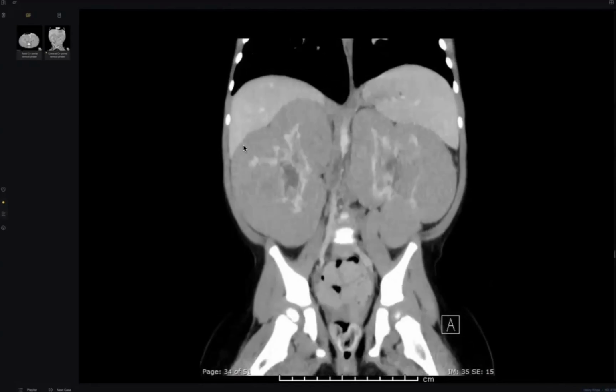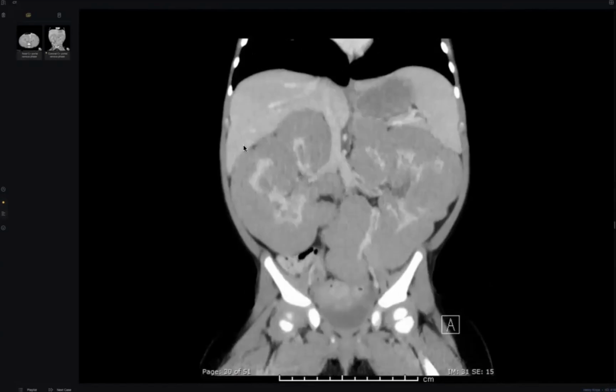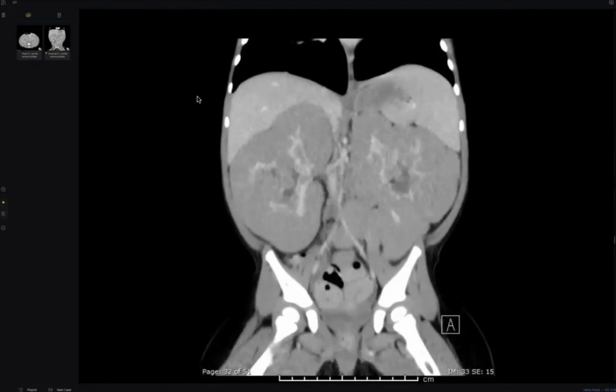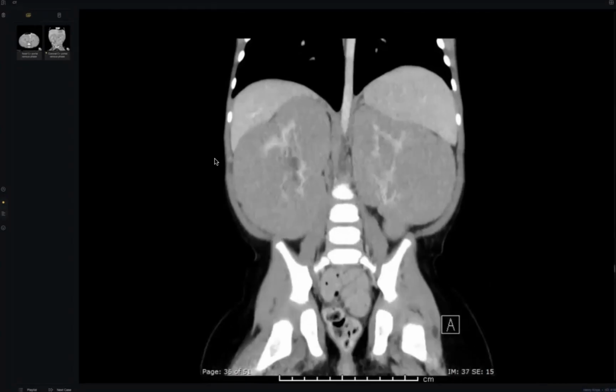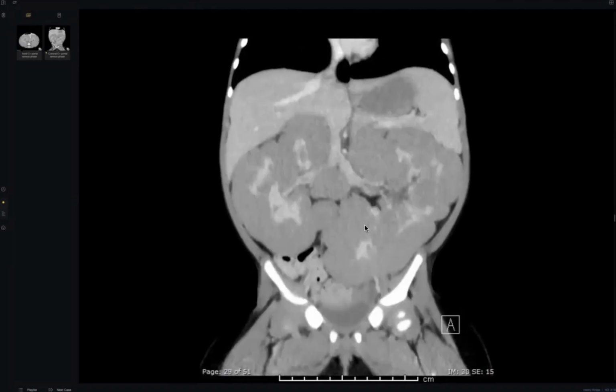Large bilateral kidneys, lobulated like this. Number one, if adult, lymphoma until proven otherwise. Number two, if very young, like this 2-year-old, nephroblastomatosis. Somebody will tell me, doctor, bilateral Wilms tumor. But this is diffuse and there are no cystic changes.